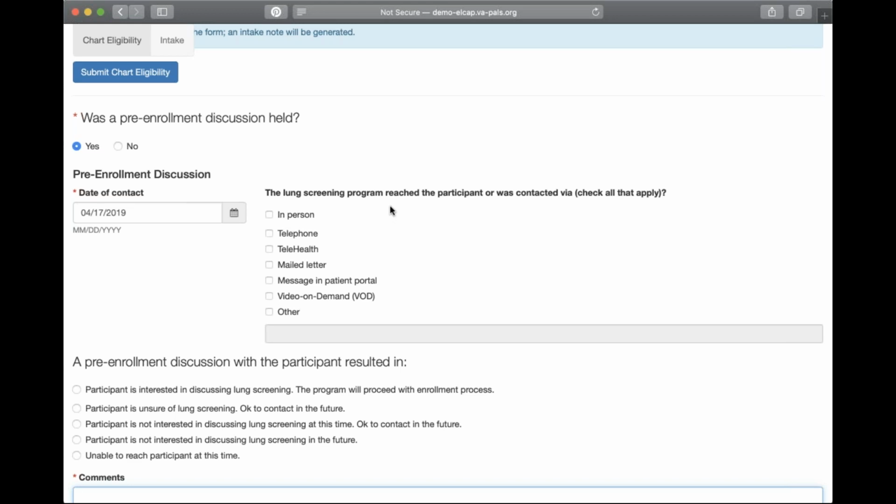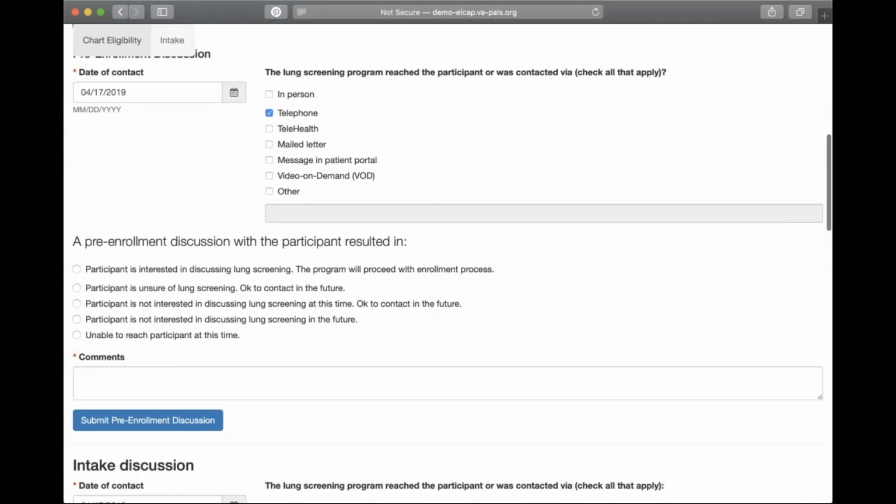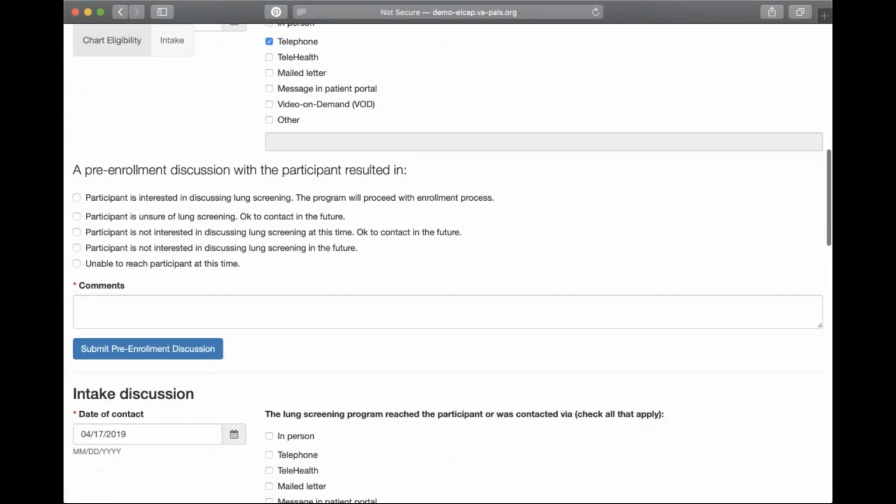So that, by the way, is an example of how I test. I just go through and I am actually fairly good at noticing things like that. And that is where I find bugs. So we're going to say that we talked to this person on the telephone and that they are interested and want to find out what's going on.